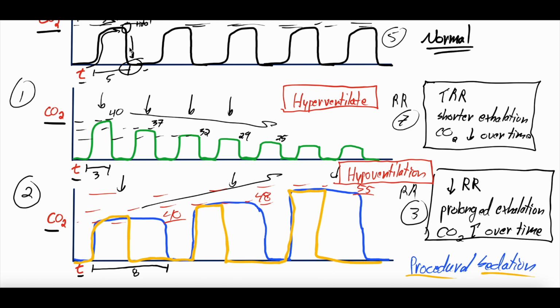You might have to do jaw thrust, you might have to cut things short, you might have to bag them a little bit. Let's say someone comes in and they're tachypnic and tachycardic and sweaty and they look panicked, and you put them on end tidal and this is what it looks like. They're probably hyperventilating, and why they're hyperventilating is a different question. But this is how these two can be helpful. Hyperventilation, hypoventilation. They're also two commonly talked about capnographic waveforms.